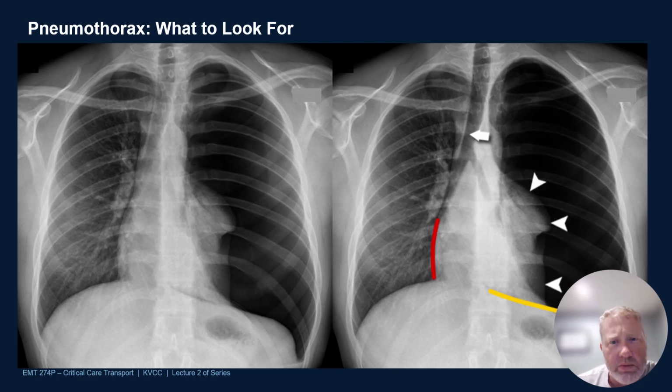When you suspect a pneumo, don't go just based on the chest X-ray. Depending on the quality and the positioning, a pneumo can be falsely misleading.